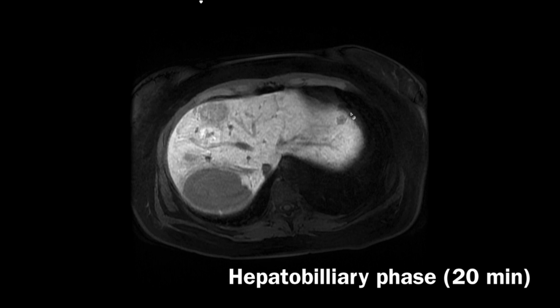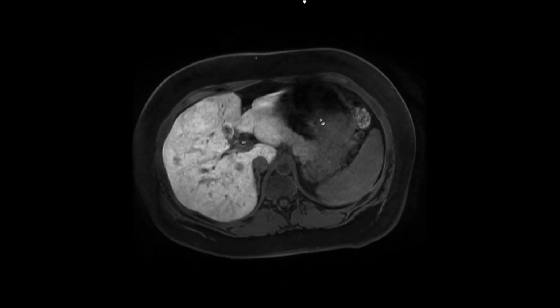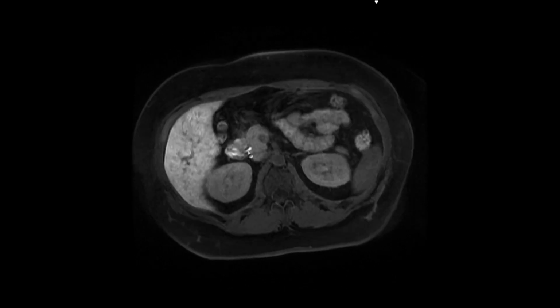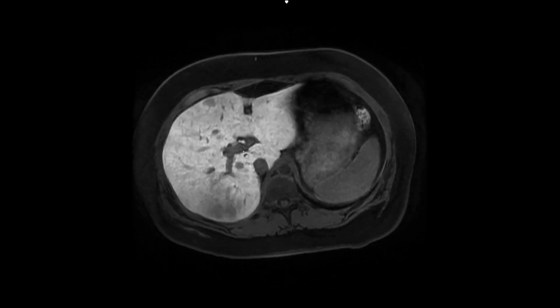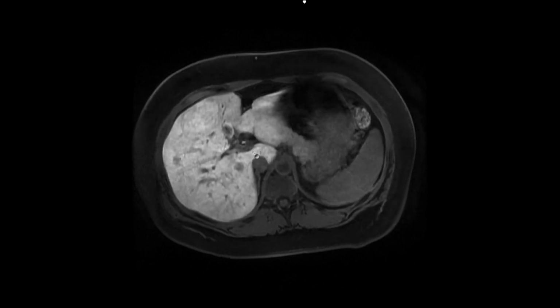So we look at these lesions on a 20-minute EOVIST scan or hepatobiliary phase, and you'll see that there is contrast in the biliary system because EOVIST or these hepatobiliary agents are excreted in the biliary systems.